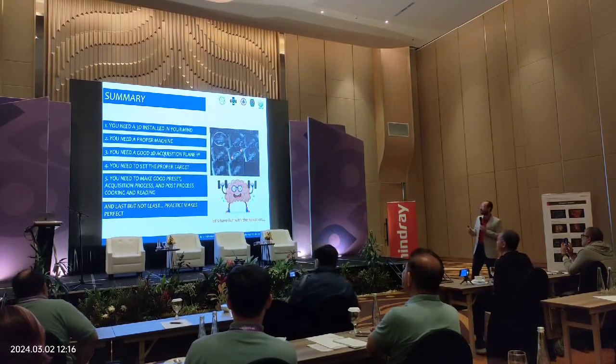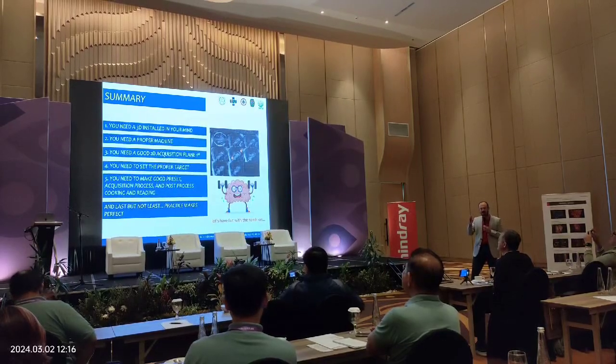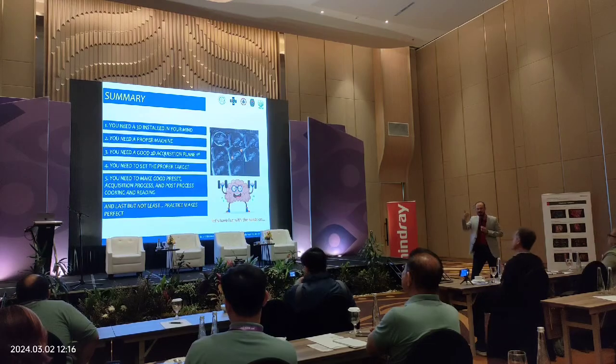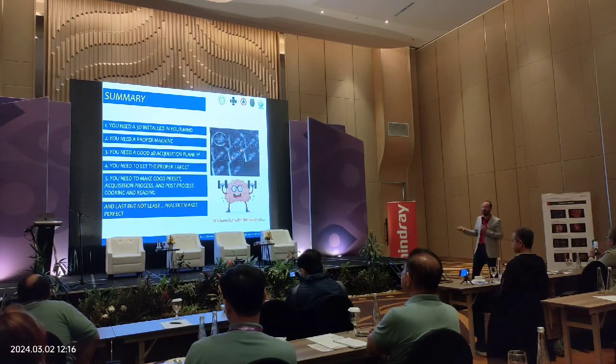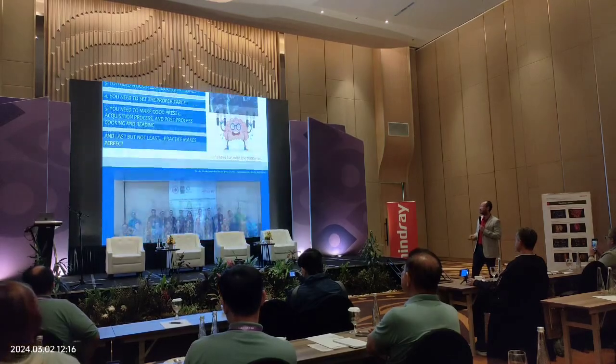For the take home message, you should keep the anatomical shape of the brain in 3 dimensions in your mind. If you want to cut it axially, mid-sagittally, and coronally, what we are going to see, we have to bear it in our mind, and we have to have a good machine, a proper acquisition and proper post-processing. And the last but not least, practice makes perfect.